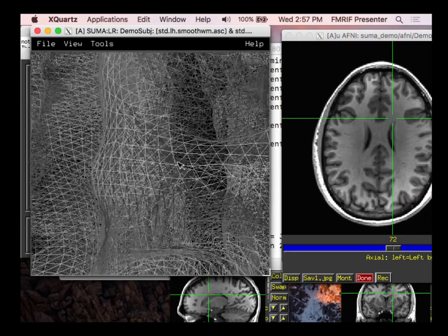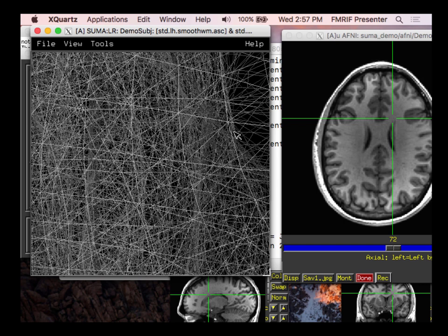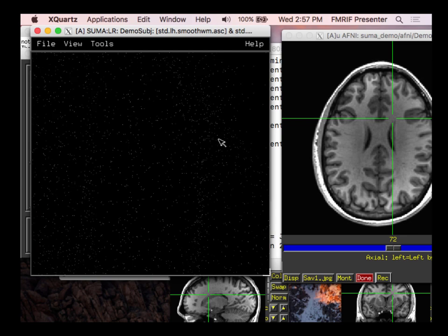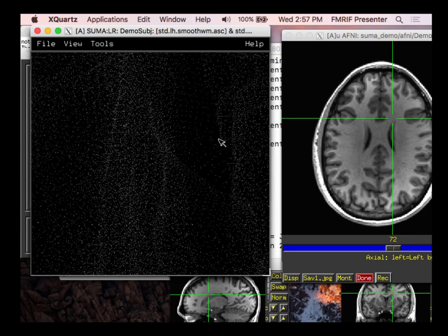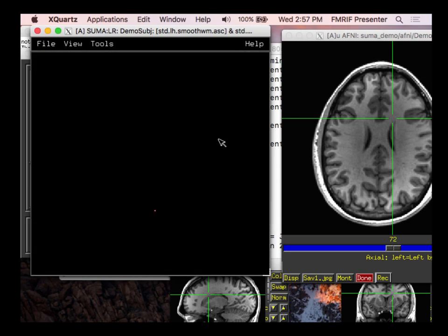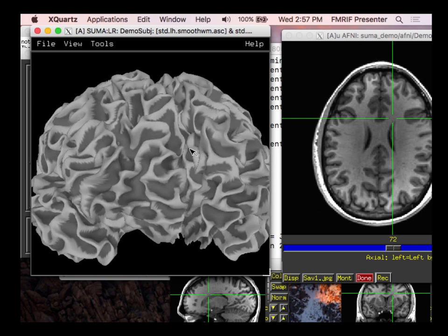And so if I zoom in, this is a node, that's a node, that's a node, and their topology is how they're connected. And if I do this, you can see, does it look dusty? Those are the nodes. It's like zooming through space. And if I zoom out, you get a little more sense of the structure there, right? Those are all the nodes, and it's gone. Okay, but it's back. So these are the different representations we have, so we throw data up like that.